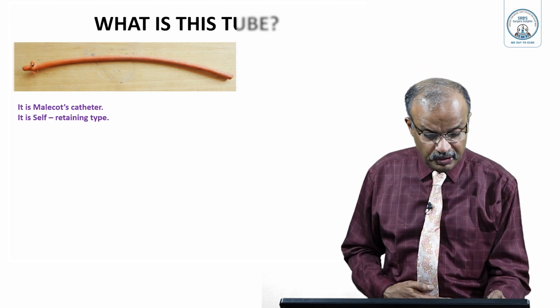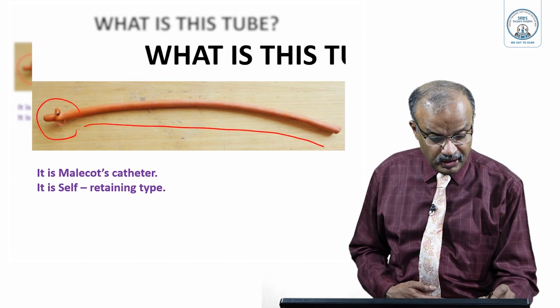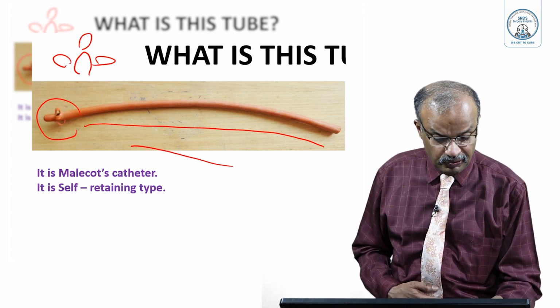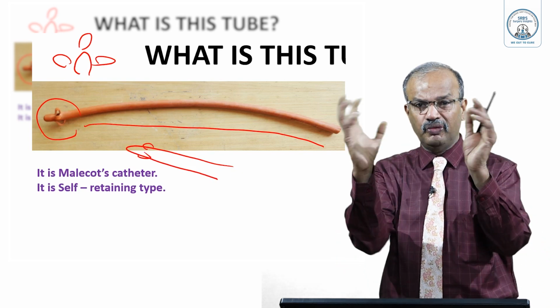It has got a stiff tubular structure, wide lumen, and here is a flower. You can see that, like this, like this flower. And it's stretchable. When you stretch this one with an artery forceps, it becomes like this. When released, it becomes a flower.